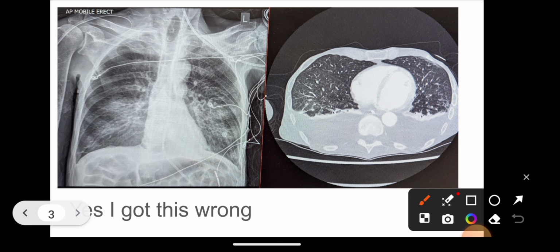And I know I get it wrong 20% of the time. There's things that I don't see or things that I suspect are a problem when they're not. And so, as I called it, the donut of truth says this is most definitely epic bilateral pleural effusions, and therefore not really something he can cough out, but he was otherwise sputumy and had a very weak cough, so had some difficulty clearing.